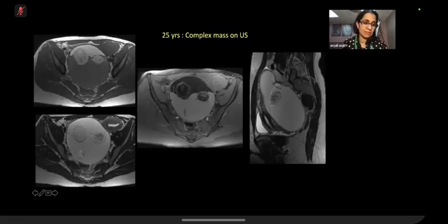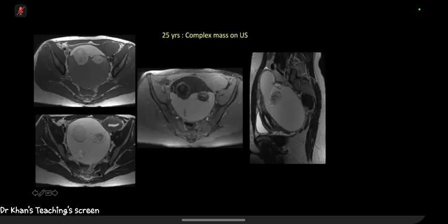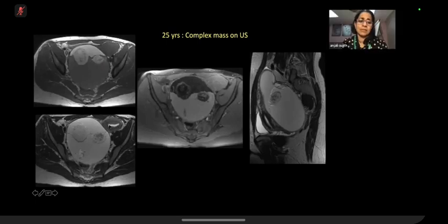So if you're given this image alone, how would you say this is a T2? I think there's some fluid within the endometrial cavity, so this could even be the bright signal of the endometrium, or fluid. So yeah, that's how you look for clues in the image.